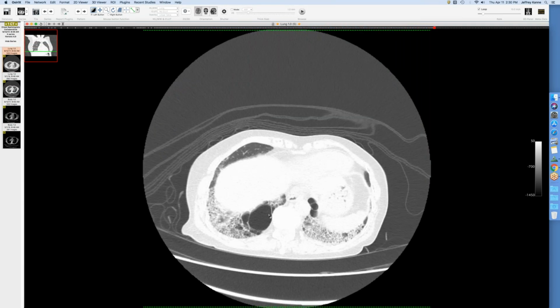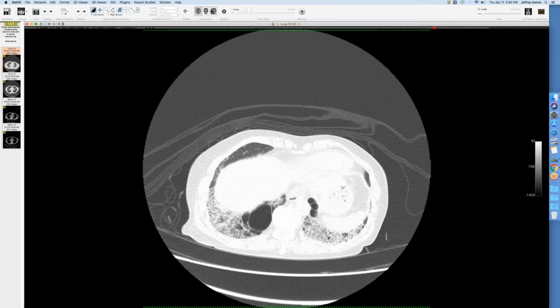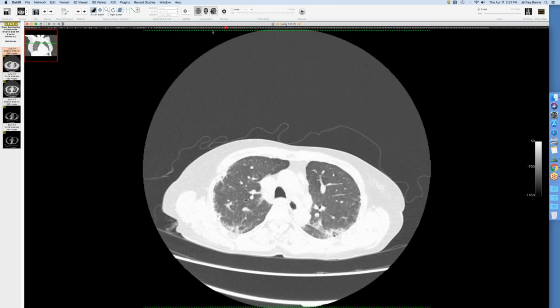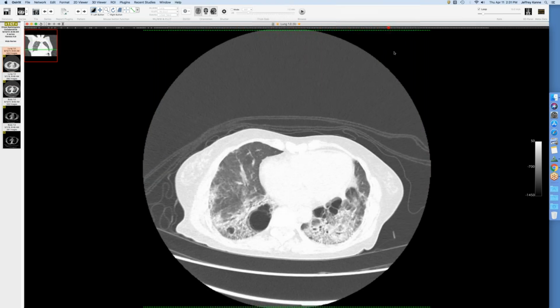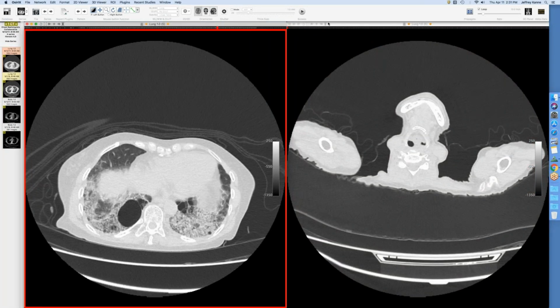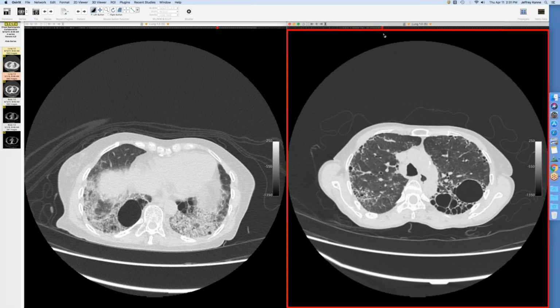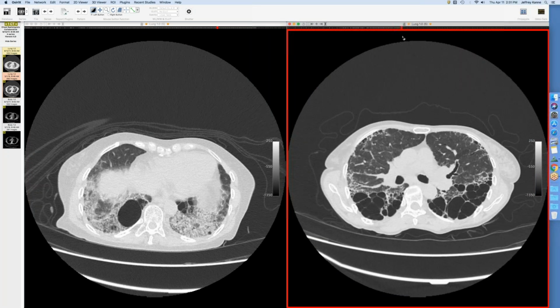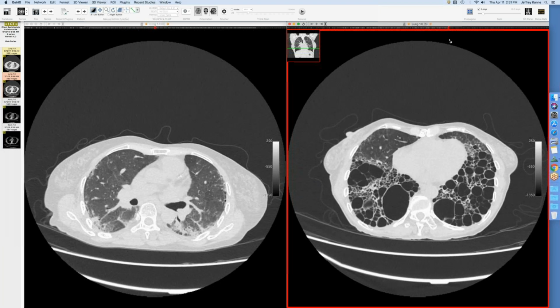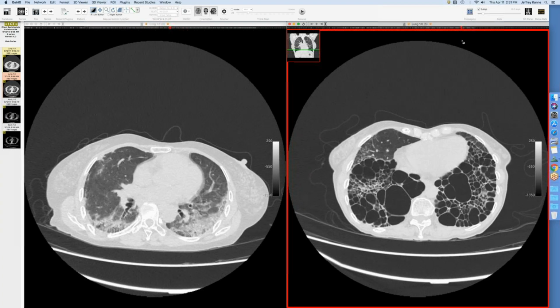And then there are these large cystic spaces in the lower lobes. Some look like honeycomb cysts, but some of them are quite large. And there is a fine reticular abnormality. So maybe an acute on chronic fibrotic lung disease with an acute exacerbation, or sort of a mixed NSIP, OP picture. But the reason I'm saying this is, look what's happened in the course of 18 months to this patient. Now we've had marked progression of these cystic spaces, sort of this macro honeycomb cyst, which has been described in connective tissue disease. It's just striking how these large cystic spaces have formed in this lung.